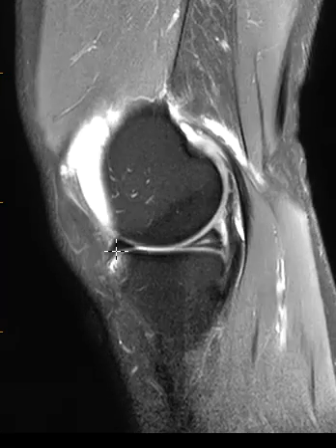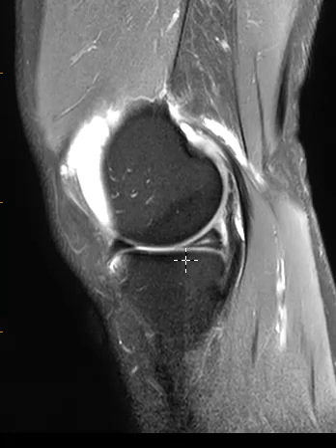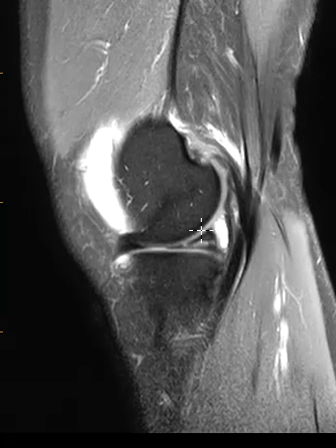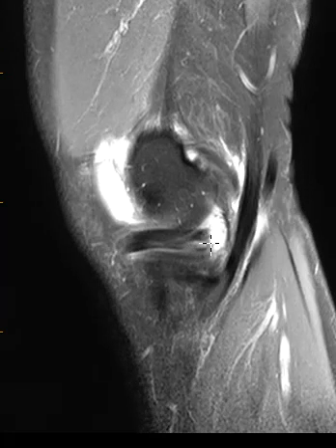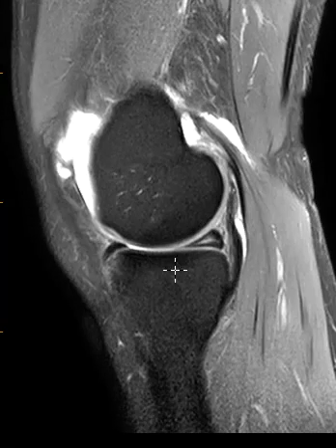This is a side view. You can see the medial meniscus, the front of it. Here's the back of it. Again, it looks like a triangle. We see that linear band in it. That's that horizontal intrasubstance type tear. It doesn't definitely contact the top or bottom, but it does come over here and communicate with this parameniscal cyst.